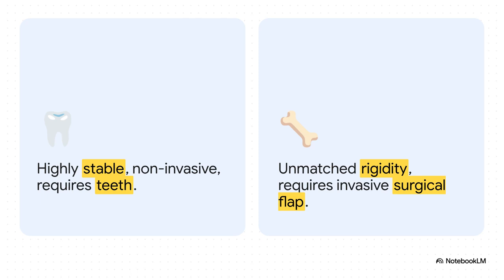But the catch? That rigidity requires a highly invasive surgical flap to expose the bone, which bumps up surgery time and post-operative discomfort. It's just a necessary trade-off when you're tackling those complex full-arch cases.